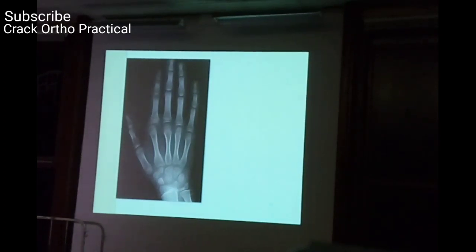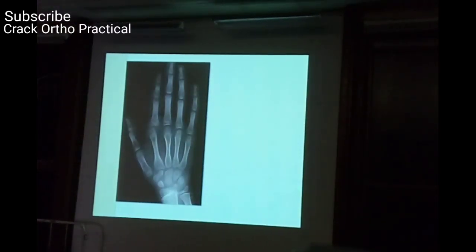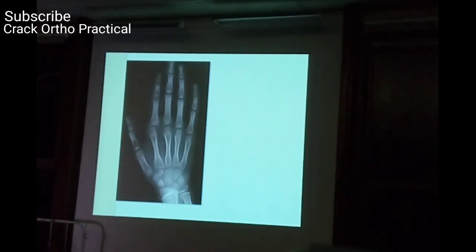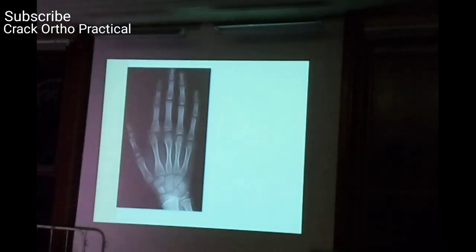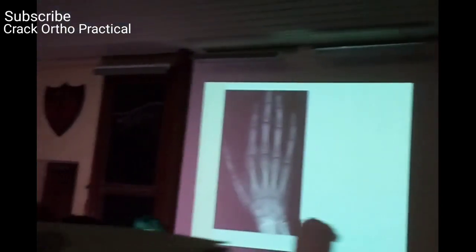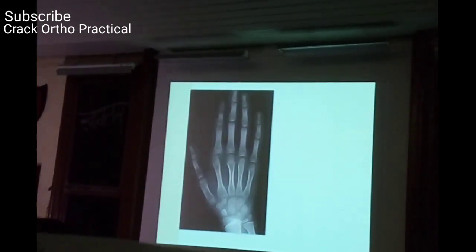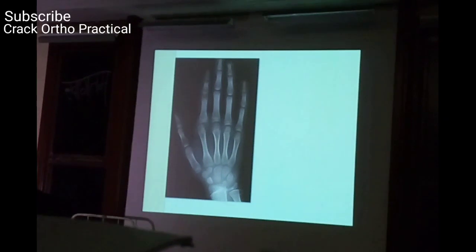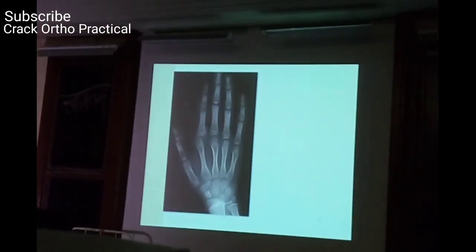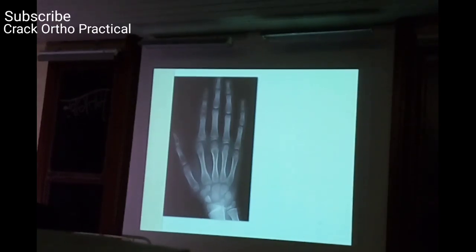So about this X-ray, can anybody tell what is it? Gokul? Describe. What is the pathology? I don't know the side. It's okay. Go ahead. AP X-ray of the hand. Tell me the pathology at least. There should be 2 views. Yes, so many people are prompting you.